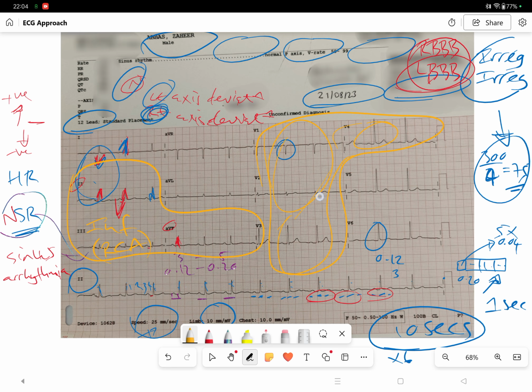And this is anterior, looking at us, so this is the anteroseptal aspect of the heart. If you look at your coronary circulation of the heart, you recall that the anteroseptal aspects are predominantly and largely supplied by the LAD, the left anterior descending artery.